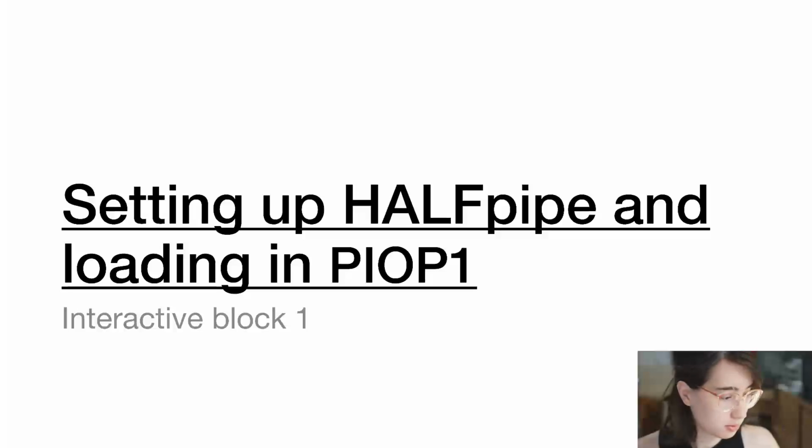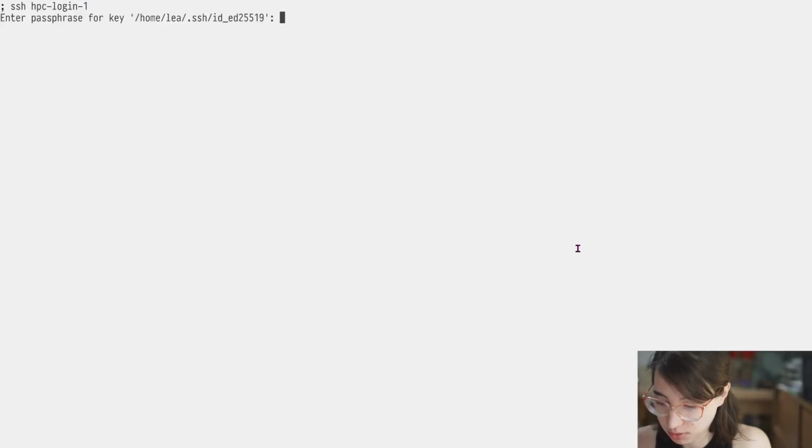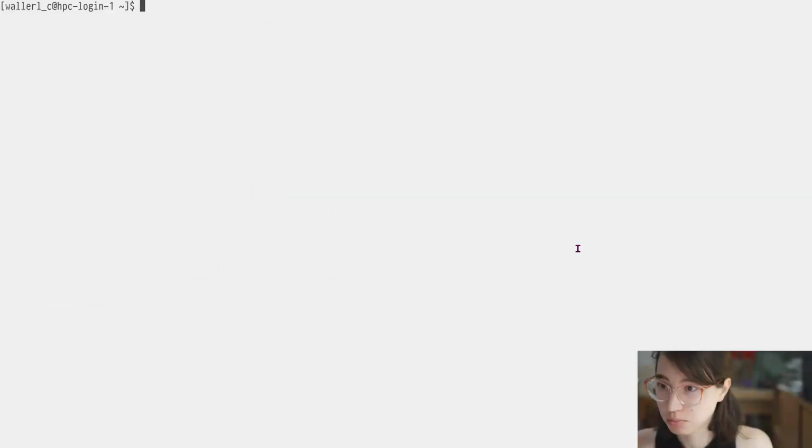So let's jump right into working with HALFpipe, and I'm going to go to my terminal over here. I'm going to connect to my high performance cluster. Type in my passphrase. Okay.